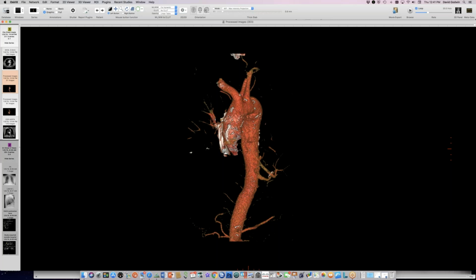And I did see one earlier radiograph that suggested he might have had infection in the left lower lobe at one point. There was some consolidation on his outside films that resolved afterwards. So I'll check the history and find out specifically why they did it in this case. But the reflex around here is to resect sequestrations before they become infected problems. We tend to leave ours alone because usually we pick them up middle age or older, and at that point, if you made it that far, it's probably unlikely to cause any problem. Good point.